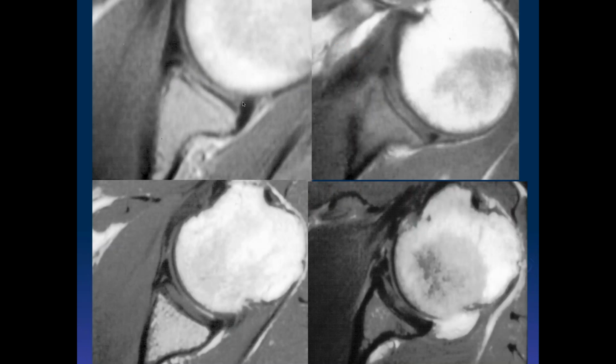So there are a number of different signals. If you notice in this particular case, this is bone, and we can see a little chemical shift artifact here. The articular cartilage goes right along the bone here. Notice here there's high signal intensity curving around the base of the labrum in continuity with the articular cartilage. And this is usually normal when that occurs.